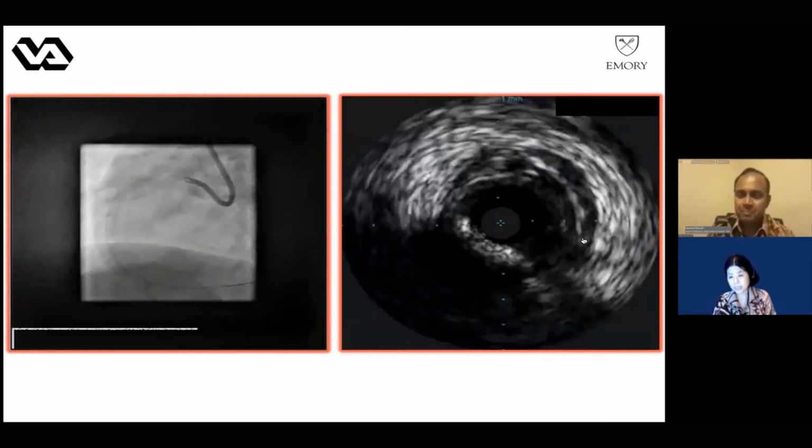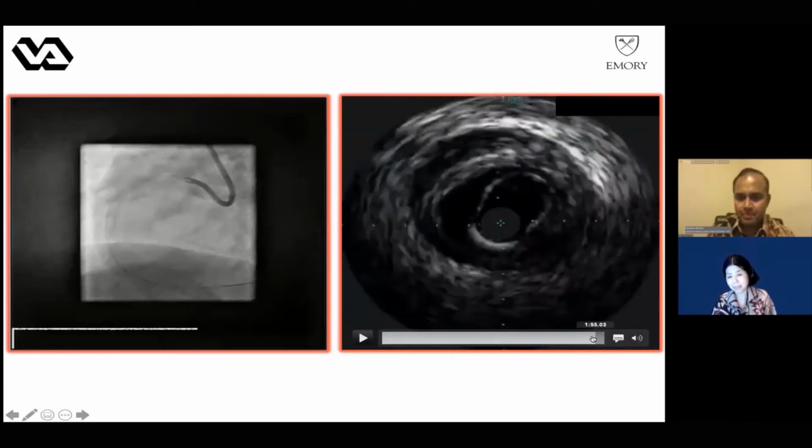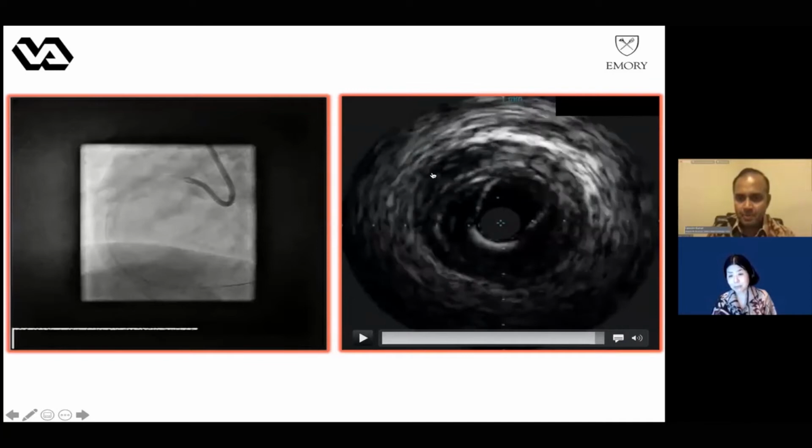This is really outside of the intima, meaning it should be either inside of the media or probably media to adventitia, some space making the intramural hematoma, which I showed in my presentation. And you see that's a very clear hematoma. That's indicating what we see. Even here you see the hematoma on top, that's very clear. So that's a very typical intramural hematoma.